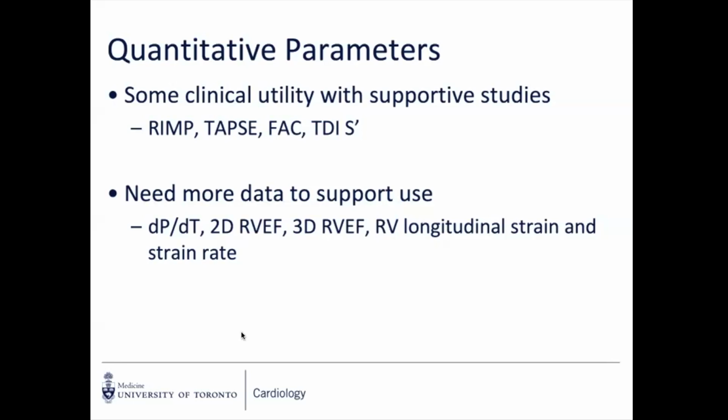Usually, by the time the RV outflow tract is dilated, the whole RV is dilated. Maybe a few clinical conditions where it's potentially not the case, maybe appearance of ARVC, for example, but in general, once it's dilated in the parasternal, you should see it everywhere. So yeah, the RVOT is making a comeback in Europe, as a previous presentation has commented on.